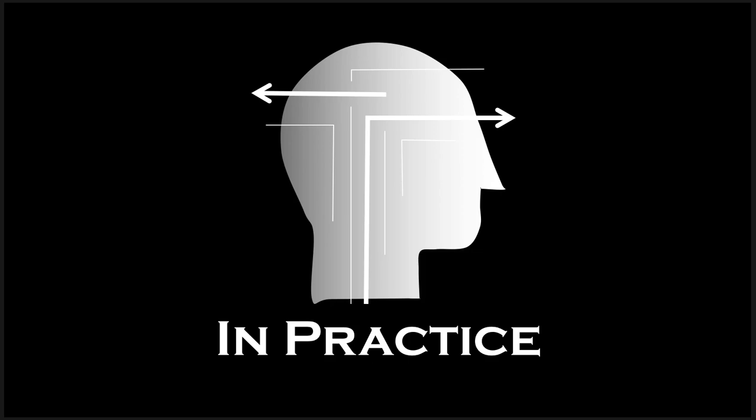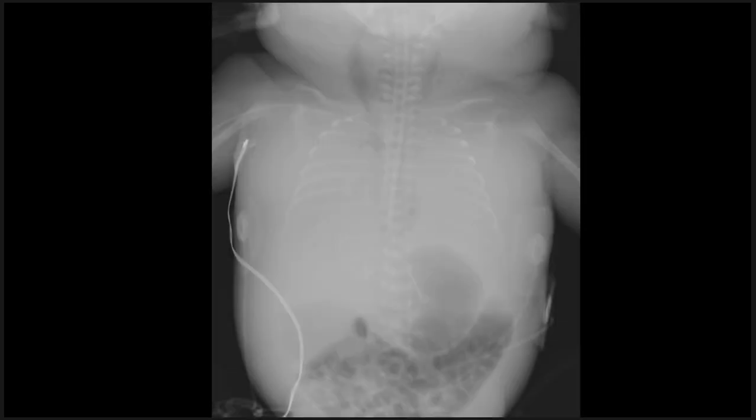Now, let's play. Let's imagine that we're in the PICU and we've had an emergent intubation under very stressful circumstances, and here we go. So I'm going to just outline the airway for you here, and then I want to point out the position of the endotracheal tube. There. That's not good, right? It shouldn't be possible for the endotracheal tube to be below the carina, unless there's one particular situation where that is possible, which would be that the endotracheal tube has actually perforated the trachea.